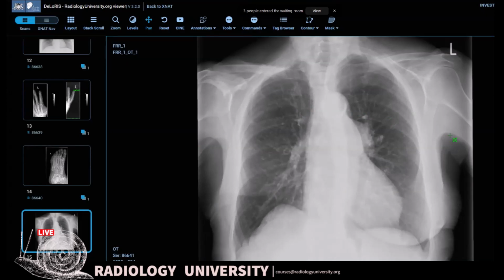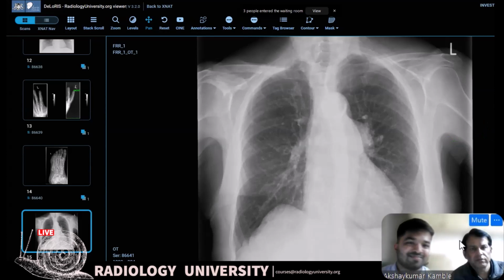This is a frontal radiograph of a woman. I noticed there's absence of breast shadows. However, there are some clips in the axilla. So I think this patient likely had a previous mastectomy. I looked at the lung. There's no focal lung mass.